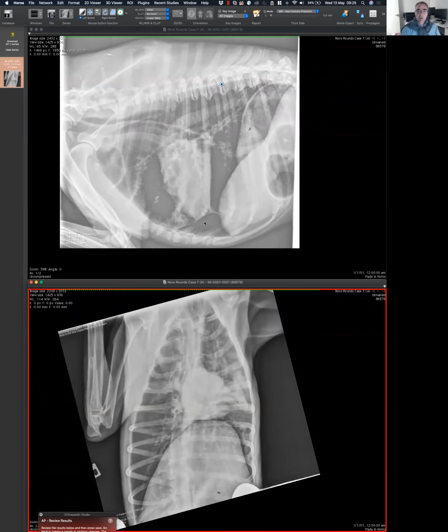The other idea or explanation to the decreased opacity, not being technical, would be hyperinflation of the lung. The problem that I have with that is that then I would want to see that in the other projection. And actually, when we have that situation, we have separation, like increased distance in between the diaphragm and the heart. The ribs get more perpendicular, which is kind of in this case, so that's probably not useful. But I would expect to see the same thing on the other projection. And not only I don't see it, but what I see is the opposite, which is increased lung opacity.